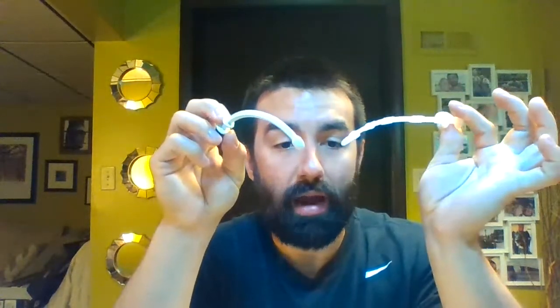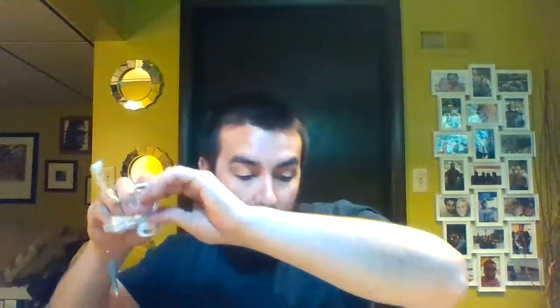Obturators. So obturators are specific to the trach. It's not like we go and grab a box of obturators. It's going to come with one, okay? But essentially that allows us, in the case of Bivona, to not only have a snowplow effect, but it adds a little bit of rigidity. Instead of trying to put this big old giant tube through, it gives us a little tip so we can start through that stoma and then slide that thing in place. Then we pull that out and get everything all hooked up. All right, so an obturator eases the insertion of an airway, but we've got to pull it out as soon as we get it into place.